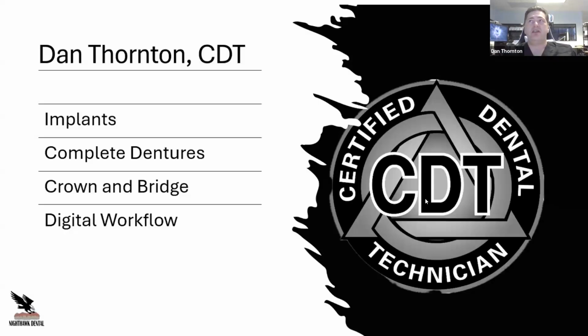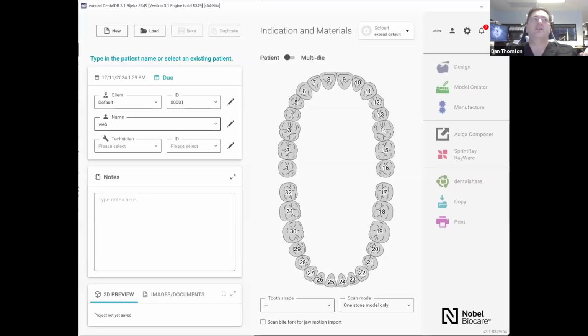So what I did is I have a case that's kind of waiting and floating around in space, and I'm going to put it together and stack it for you. We're going to step it through. Give me a minute to find it. All right.